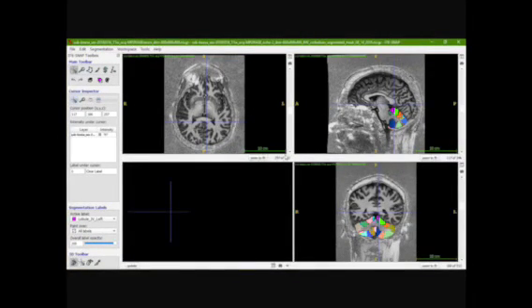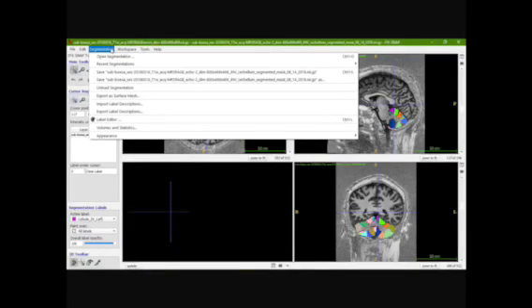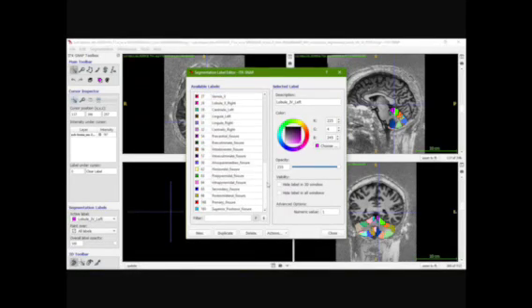Now I am going to take you through the process of creating a label. A label is used basically to assign a specific segmentation of the anatomical lobule. So what we're going to do is go to Segmentations and then Label Editor. Here I already have all the labels that I've used, but I'm going to create a new one. So I am going to click on New.